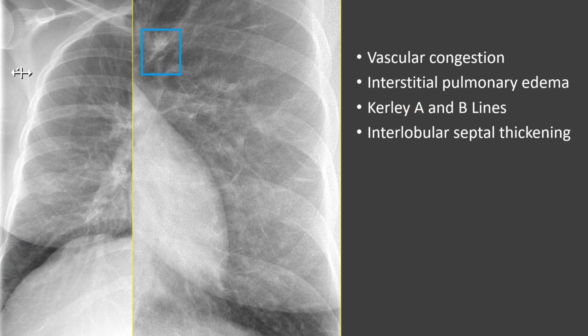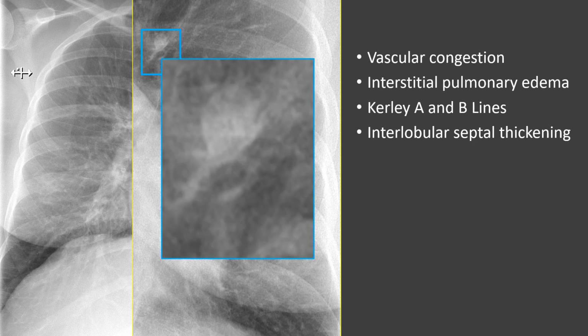So let's blow up another area here. Going a little bit deeper, this is like inception, just a little bit deeper into this radiograph. We'll blow up another area. We blow up that area, and what do we notice here? We see that there's a vessel, and we see that there's an airway. If we look at this airway, it is just, again, too thick. These airways should be paper thin. So we can see that there's thickening of the airway. This is what we call peribronchial cuffing.